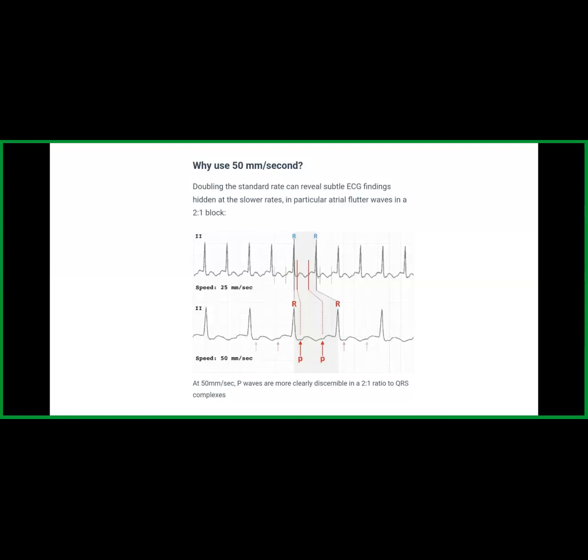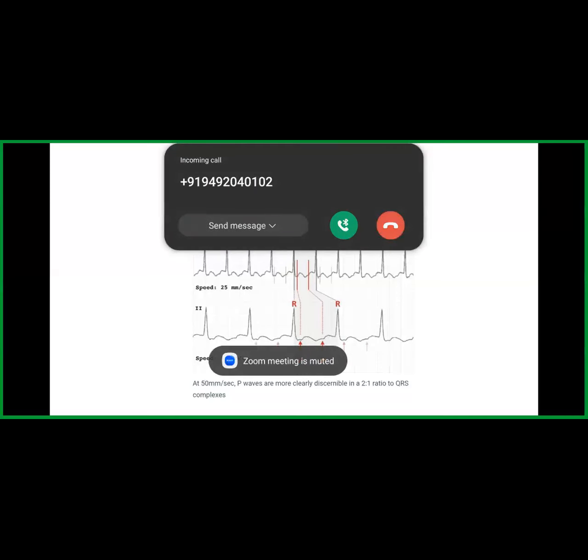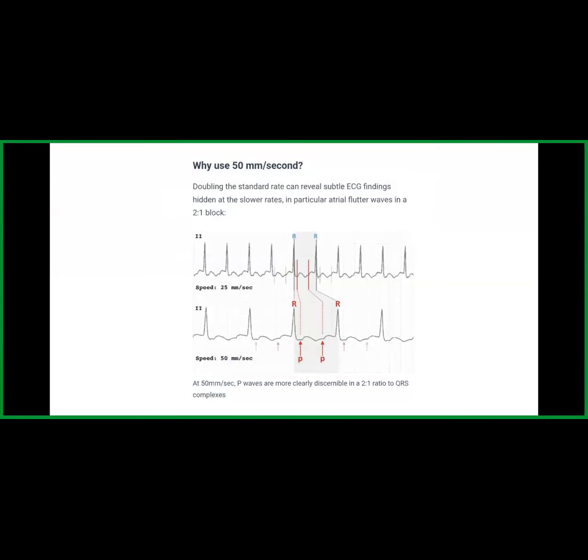So once we have these kinds of rhythms available, we check the proper waveform to understand the contraction and how much excitability of the ventricle there is after the contraction has started in the atrium. This matters primarily in children who have tachycardia or myocarditis, and if you're in the ICU and searching for a P wave to label whether this febrile child is going into SVT or is in sinus tachycardia.